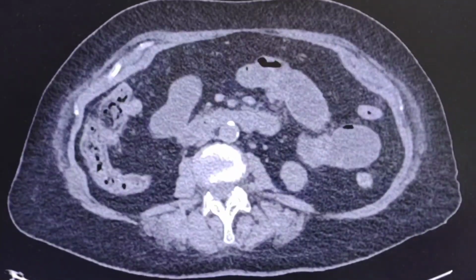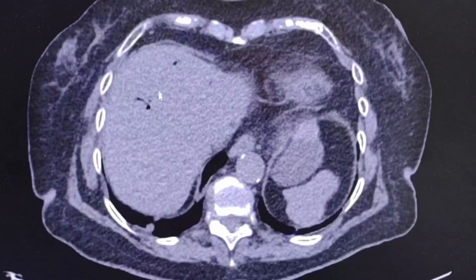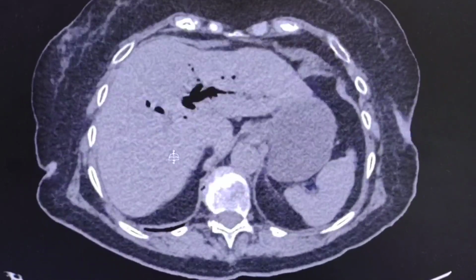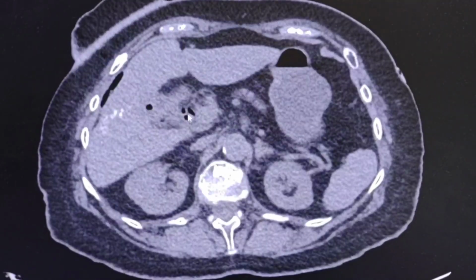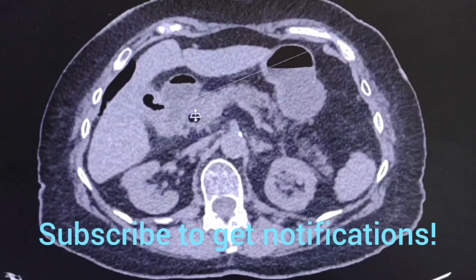So the next point is to find the cause of the obstruction. But another interesting point is that there is pneumobilia here. And the anatomical region between the gallbladder and the duodenum is abnormal.